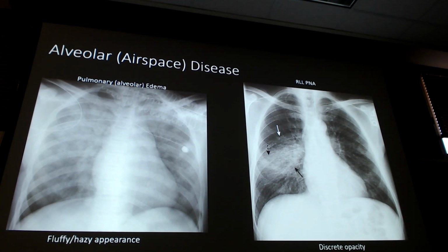What you're starting to see, and this is what I wanted to make sure, you'll see some better pictures of it later. I want you to look at the white arrow, right underneath the white arrow, okay? The black arrows are pointing to where the pneumonias are, but look just above, underneath that white arrow. Do you see how it's light grayish, but in the middle it almost looks like a darkened tree branch sitting in there? Can you appreciate that? Right in here. That is your air bronchogram.